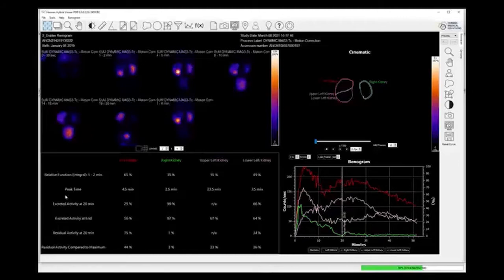In the next example that I'm going to show for the post-MIC geometric mean, I have a blood region configured. So we could turn on the duplex mode and have a look and see if it actually will. Maybe we should do it live. Maybe not.